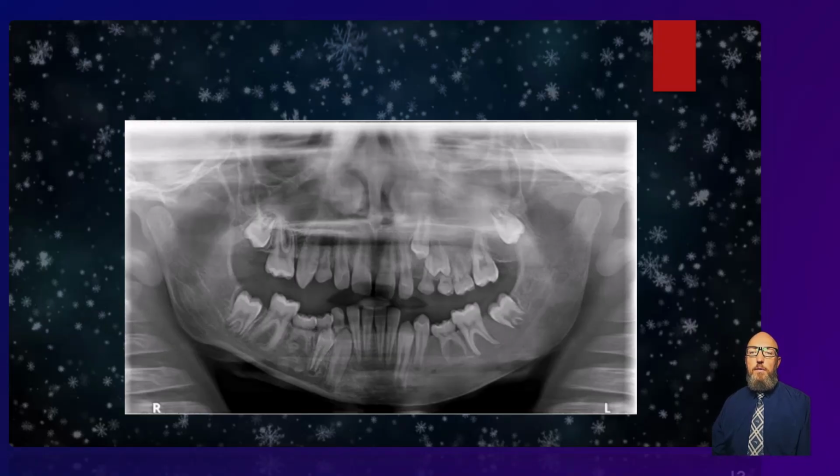So this was one of our polyostotic fibrous dysplasia. This is McCune-Albright syndrome, typically associated with cafe au lait spots and endocrine overactivity, classically precocious puberty, and predominantly in females. So here it involves both the left maxilla and the mandible. Hopefully you appreciated that ground glass pattern and went right away to, okay, fibro-osseous type lesion, and the most common being fibrous dysplasia. Multifocal ground glass in a young patient should bring polyostotic fibrous dysplasia and its syndromes to mind.